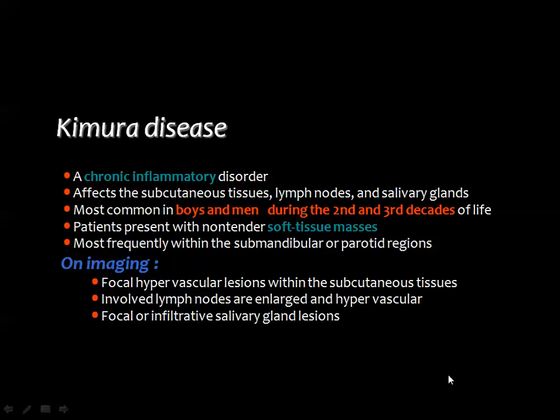On imaging, you get enlargement of the lymph nodes that are homogeneously enhanced and hypervascular, and you get unilateral or even bilateral involvement of the salivary glands, especially the parotid gland.